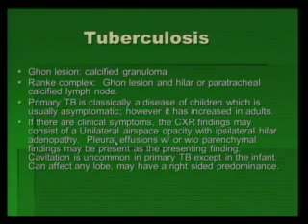It can also present with a pleural effusion, and that might be all you have is a pleural effusion. So theoretically, if they have a positive PPD and all they have is a pleural effusion, that could be active TB. It can have pleural effusion with or without parenchymal findings as the presenting chest x-ray finding.